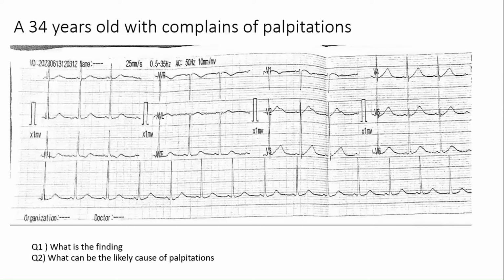The thing is, it's pretty obvious, but your eye should be trained to just skim through all the parameters. So what's the diagnosis? It looks like early repolarization syndrome. Okay, anything else? Just QT prolongation is there. Yes, yes.